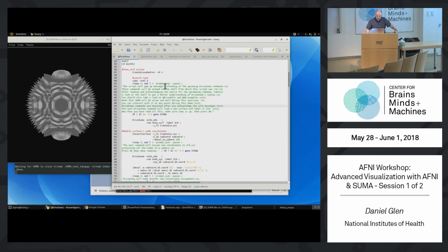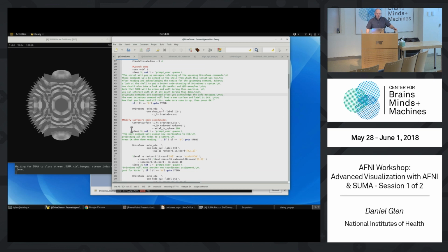let's see if I can show you that. I wasn't sure if it was true for everyone. I did update the Git repository because I figured an extra 3 seconds sleep for this demo can't really hurt. So if you edit your file, as I did, you can replace all your set L's with sleep 3 semicolon set L, and that would insert a 3 second sleep before each prompt.